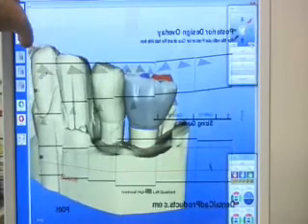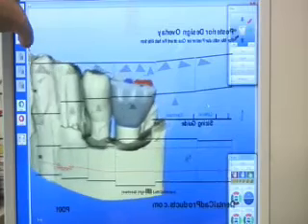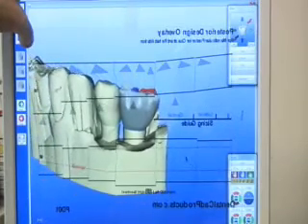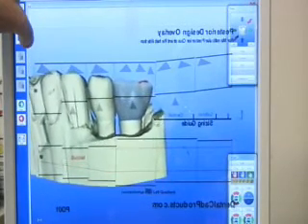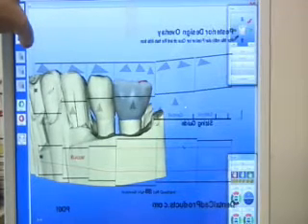We're able to resize the virtual model with the zoom plus, zoom minus to get the virtual model to fit to the overlay. By using the left trackball button and the trackball, we're able to change the pitch and the yaw of the virtual model. By using the right trackball button and the trackball, we're able to move the virtual model in its entirety.